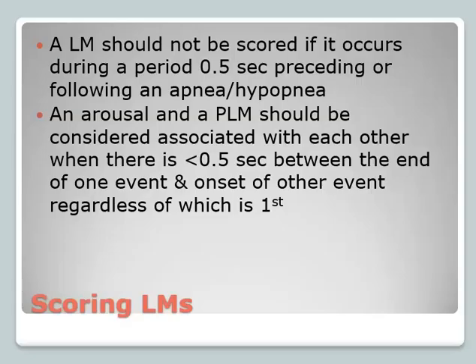If the arousal came first and then you have a leg kick, then you can say that the leg kick is a result of them waking up, not a scoreable event, right? Because it's not a diagnosable disorder when they're just kicking or moving because they just woke up.